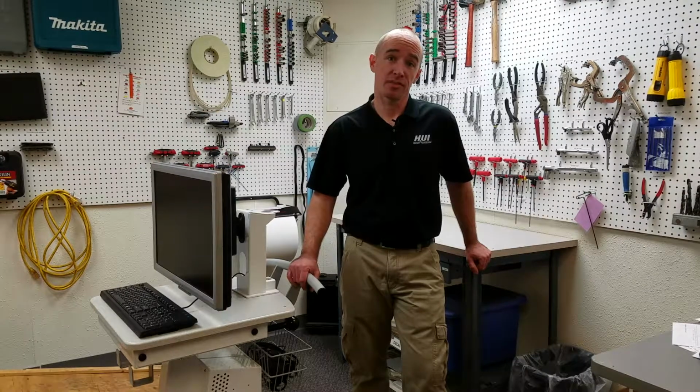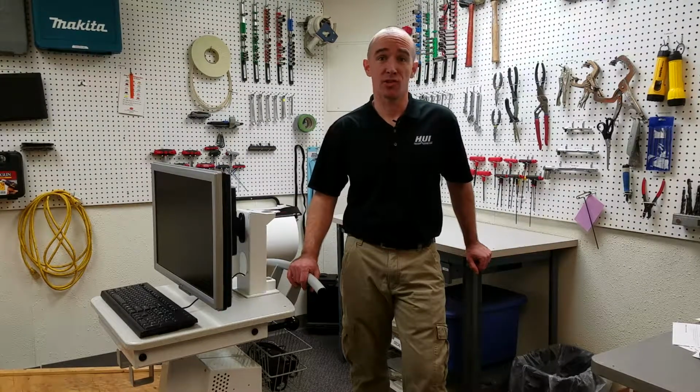Today we're going to talk about the 60601 test dealing with instability in transport and non-transport mode.